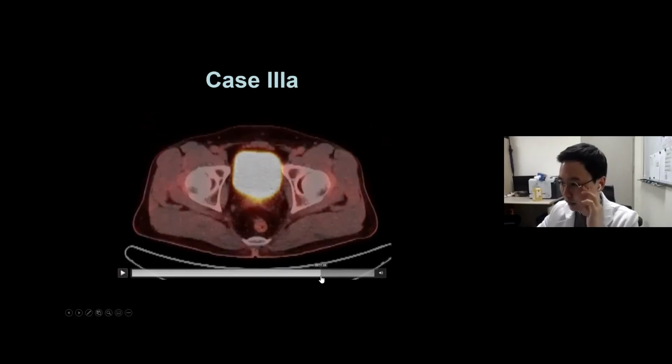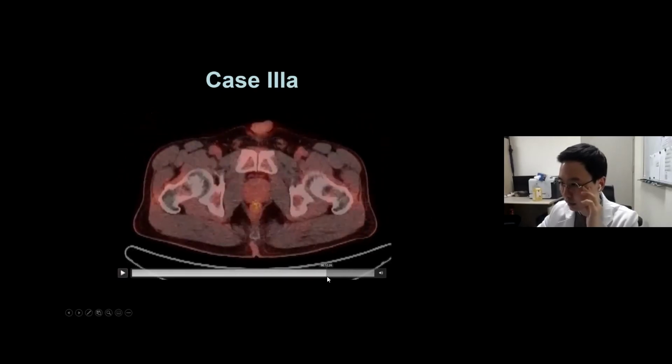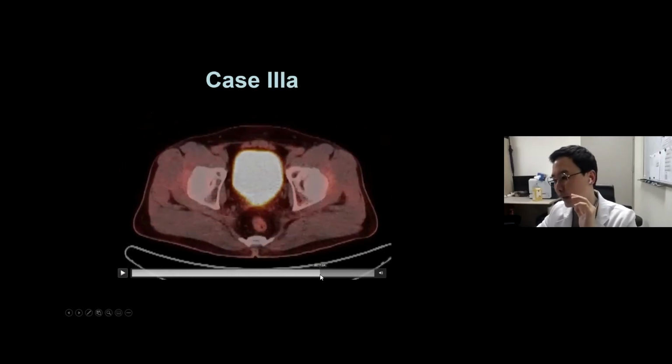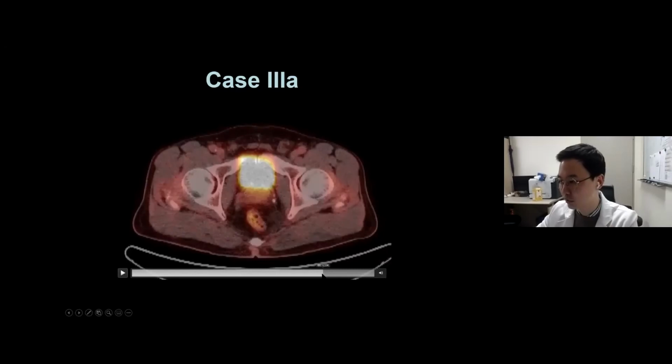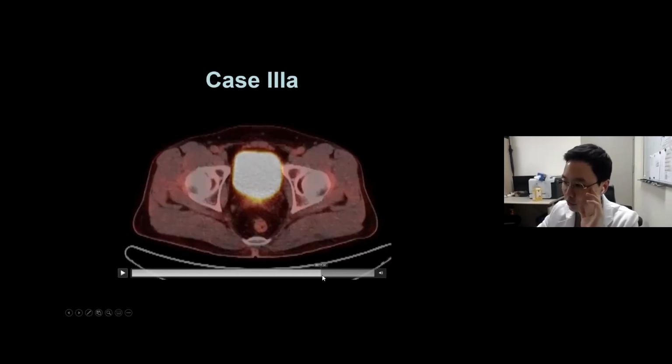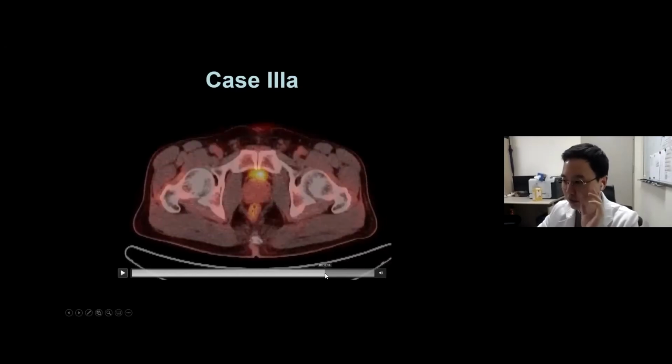However, for the prostate lesion, as you can see, there is no demonstrable uptake in the alleged lesion, which was depicted in the MRI. There is actually no demonstrable lesion in the prostate.